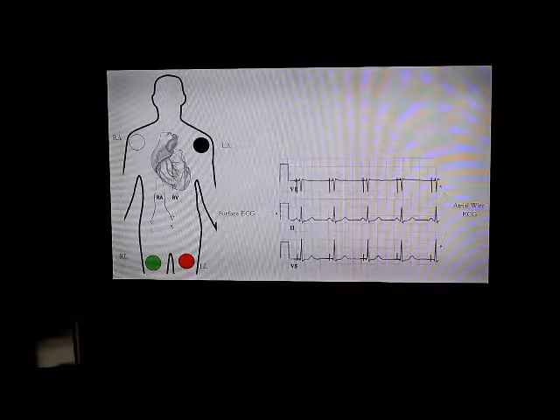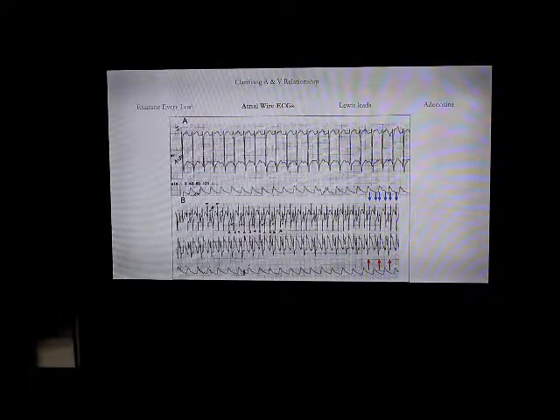And this is very helpful in post-operative patients, or even patients who have pacemakers, dual chamber pacemakers. That will be very helpful if you actually have a chance to interrogate the pacemaker while the patient is having arrhythmia. So this is the way you do it. You put the 4 limb leads, and then V1 and V5, you attach them to the atrial wires. So this is an example of one. And actually, in some hospitals, they can connect the wires to the telemetry. So you have a telemetry strip that has atrial spikes, which is very helpful.